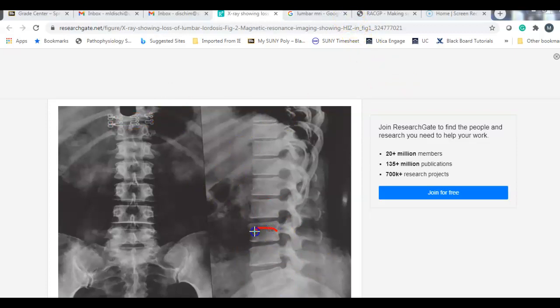But there's a little loss of bone density here, which could be something else going on. I would absolutely send her out for a CAT scan just to make sure, God forbid, that there isn't anything weird going on. That's enough of a difference if you look at that loss of bone. This would probably be compressed, but I'm just thinking I would absolutely send her out for further studies. But anyway, there's abnormal pressure on these vertebrae because you don't have that nice springy curvature.